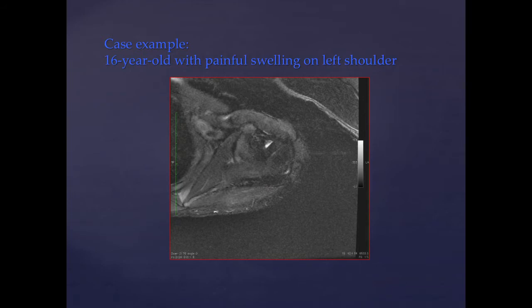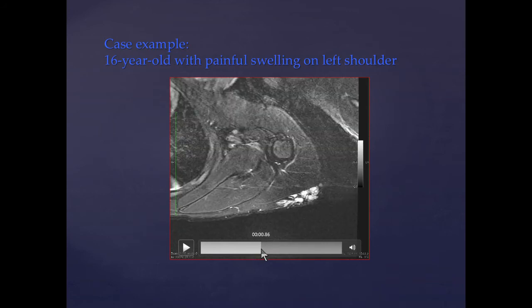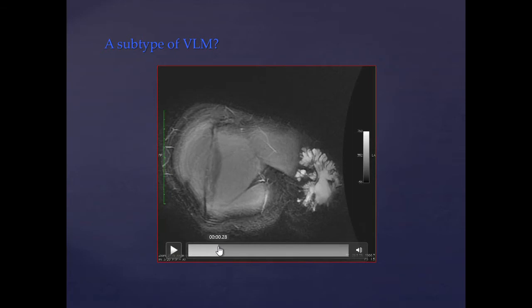This is an interesting malformation. You can see that in this axial contrast-enhanced T1-weighted fat-suppressed image, this large lesion here in the shoulder becomes much more conspicuous. On the coronal images, this is a teenager who presented with pain. You see this large stellate or cauliflower-looking lesion. It enhanced after contrast administration, and when we aspirated it, it was pure blood. But there's really no flow in this. There's no inflow, there's no outflow.